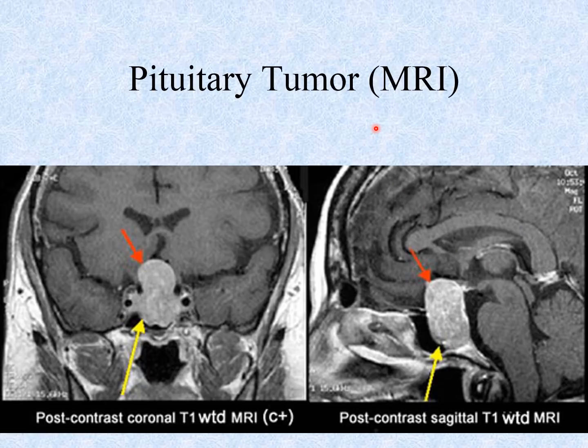In this pituitary tumor, we see using the MRI at the base of the brain, engaging both hemispheres, both from the coronal section as well as from a sagittal section, using an enhanced material to bring out the MRI abnormality.